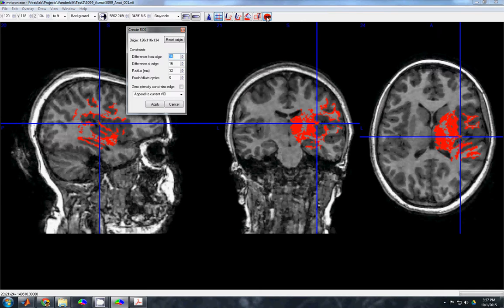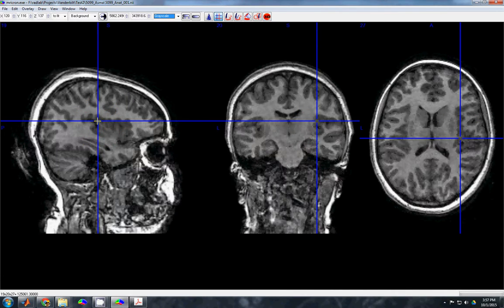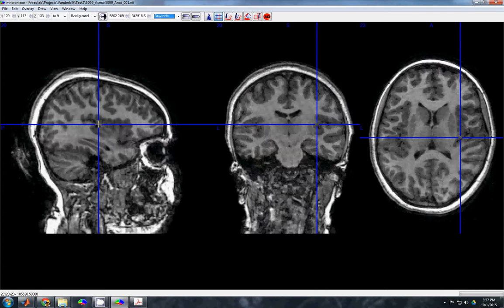We're going to use the 3D inflation tool. When you click on the 3D inflation tool, it will immediately try to inflate where the crosshairs are. So let's make sure that our crosshairs are really where we want them to be, in this case on the long dorsal gyrus, area number 1. If we want, we can play with contrast, but generally the defaults are going to be what we're looking for here. So if we're not happy with how well we could see things, we could try making this 10,000 or something, but how much is that going to buy us. So I would just leave that as the default.